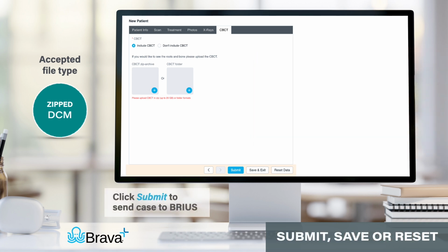Once you are finished, click Submit to send the case to the BRIUS clinical team. It will first go through a records review prior to sectioning and aligning. Once BRIUS has all information needed, the treatment plan will then be sent back for your review within 2 business days.